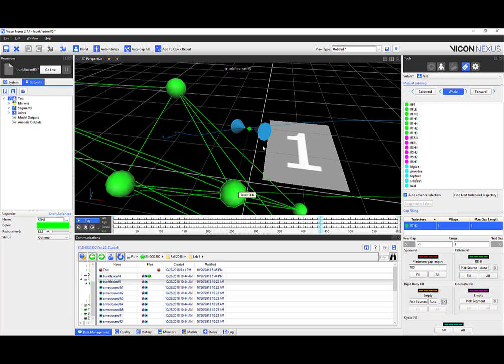I'm happy with it. You go ahead and select fill or all. I would go ahead and select all. That way, if you had like 100 gaps, you don't have to. So choosing fill does one gap at a time, and that'll be very annoying if you have like 100 gaps. If you were to select all, you're basically saying, okay, you know what? For all the times throughout the entire trial, this guy goes missing, let this guy be its buddy, right? That way, whenever he goes missing, this guy will fill that gap, no matter how many gaps there are. So I'll go with all.